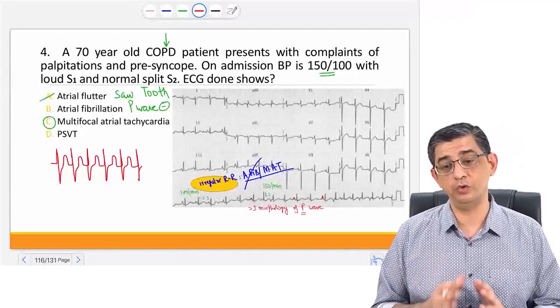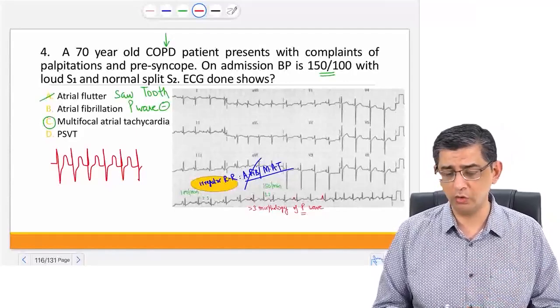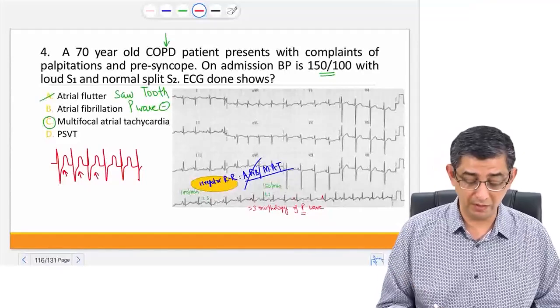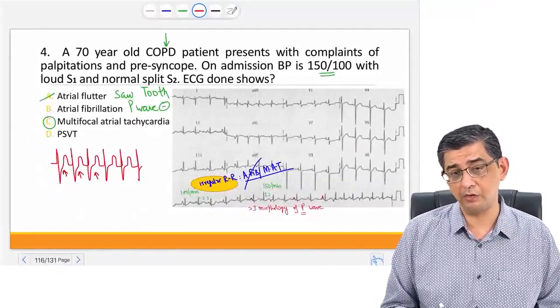Those two lectures, if you go through them at least 2 or 3 times, then in your subconscious you will have an imprint regarding what arrhythmia is present, and you will be able to pick up these minor points in the question by which you will be able to identify which kind of arrhythmia is present, and then definitely the treatment part of this can also be asked. The answer to this question is option number C. The highlight was irregular RR interval.